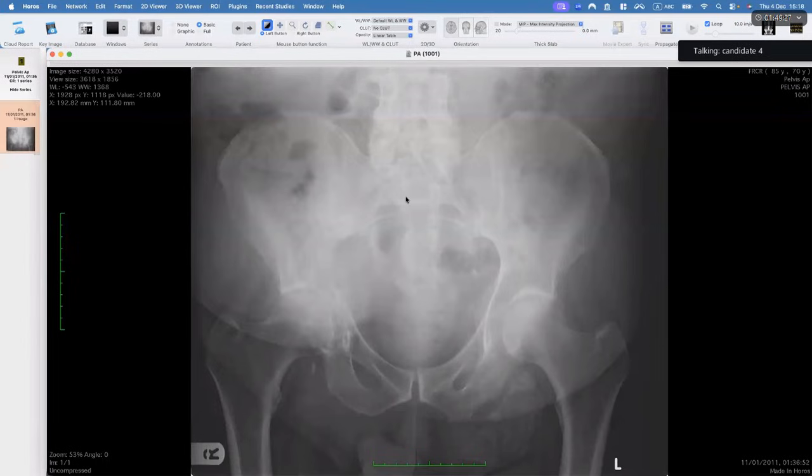It is within the soft tissues. Can you point it out? Yeah, this one. That's vascular. So the prime pathology that I can see, I cannot appreciate the sacrum appropriately in this windowing. Sacrum is fine. Yeah, with windowing we can have a look. Otherwise, if it's fine, I cannot appreciate any other abnormality.